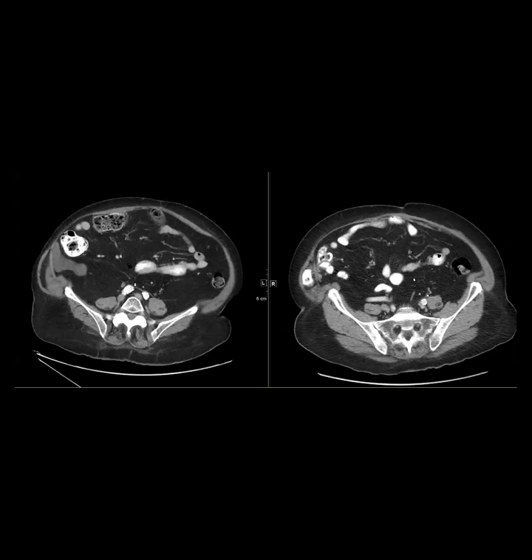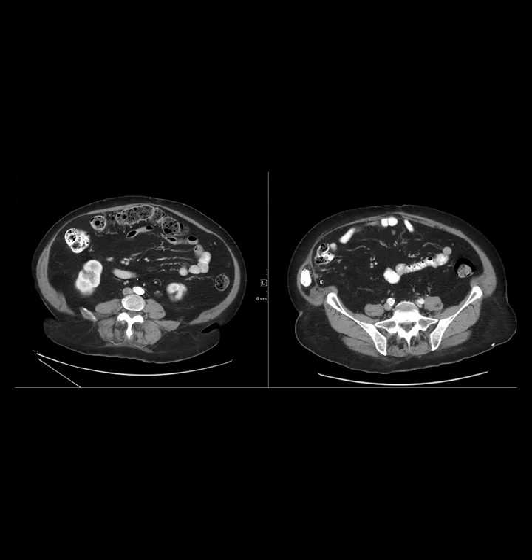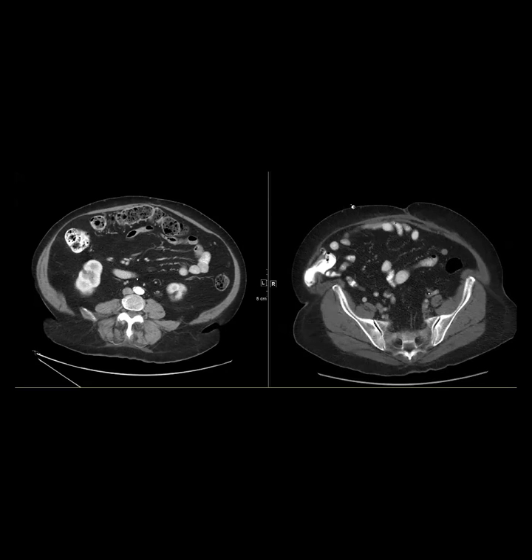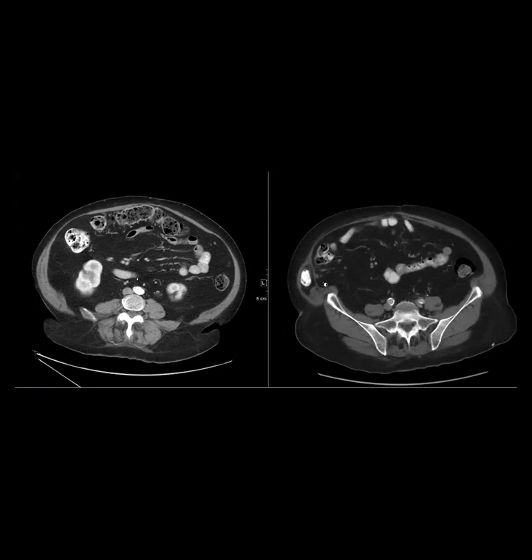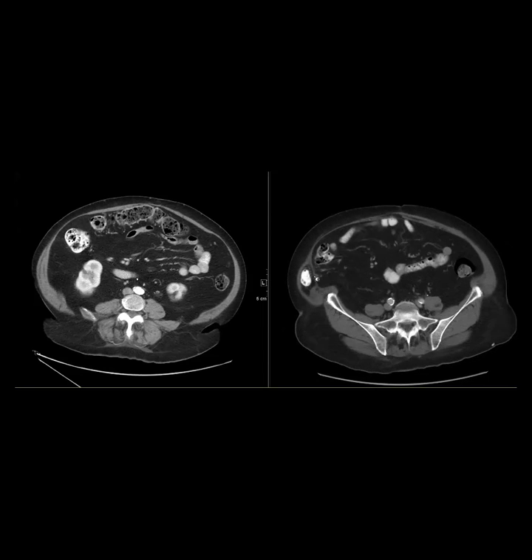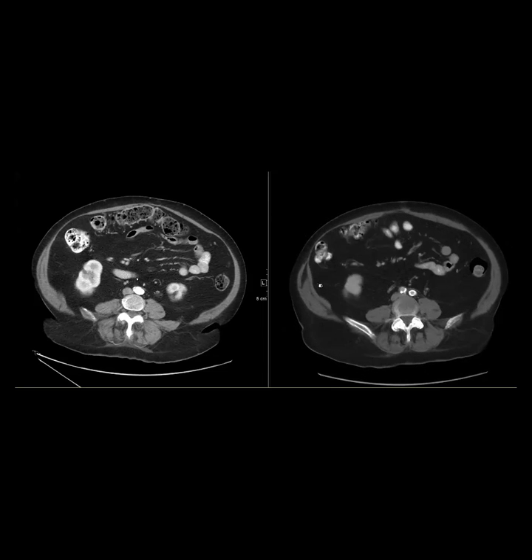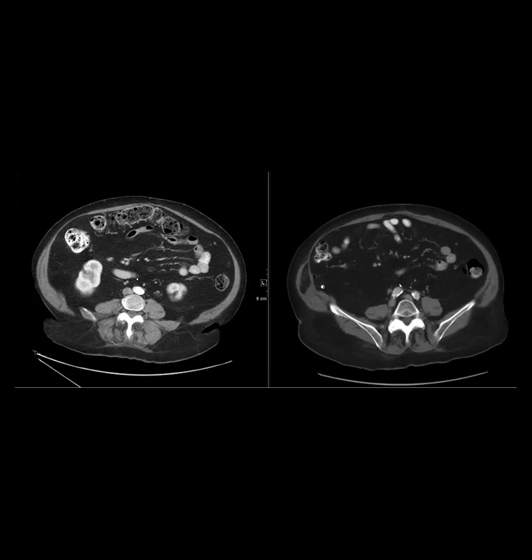Okay, and then my last case is a cute case. This patient had a right lateral hernia, and you can see, on this very old scan, that the cecum was going into the hernia sac. Here's the cecum coming out, and the appendix is right here, and you can see it comes out from the hernia sac and goes up.